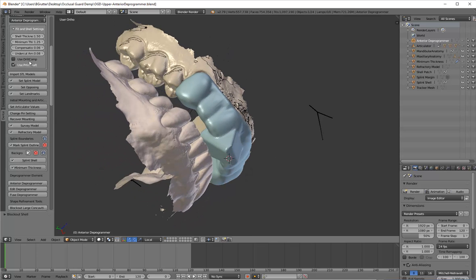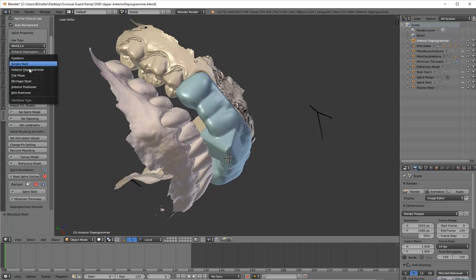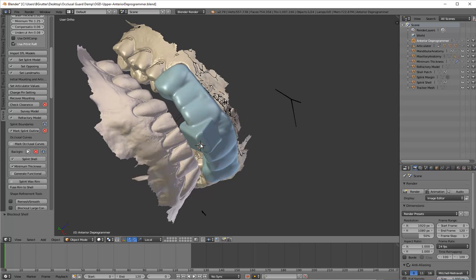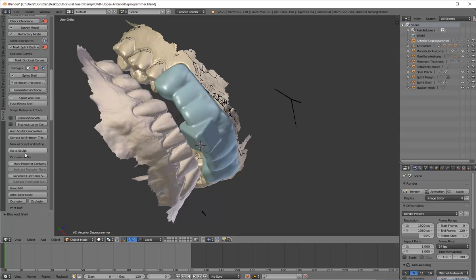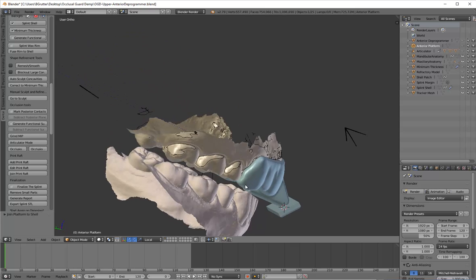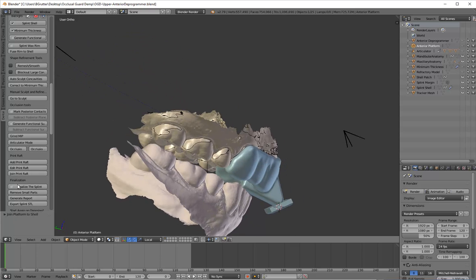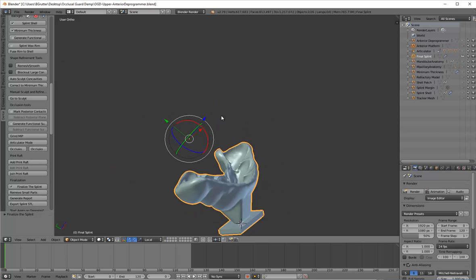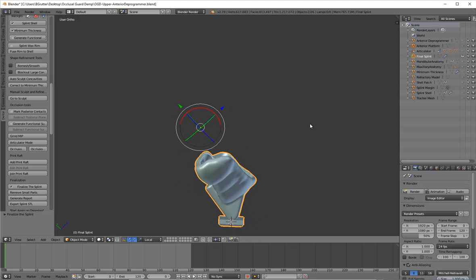And now I'll go back up and do what I just did a moment ago. Change it to flat plane. Where I clicked is still preserved. Let's go ahead and say add print raft. Join print raft. And finalize splint. Now it's going to cut out the inside where it was all bubbled inside, and now it fits the teeth. And this is how I will print.